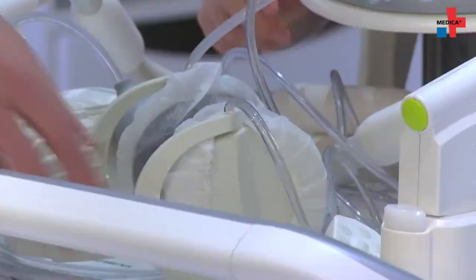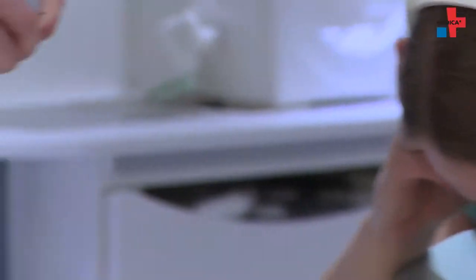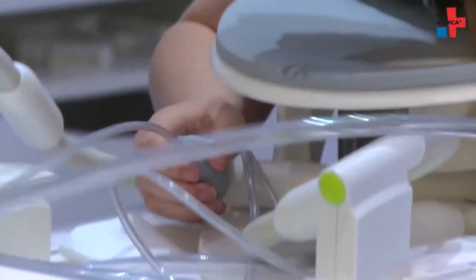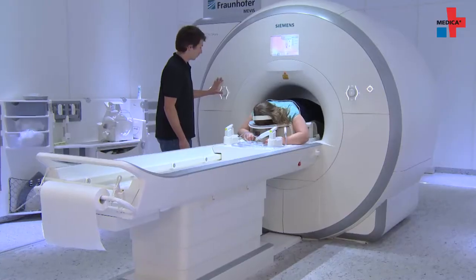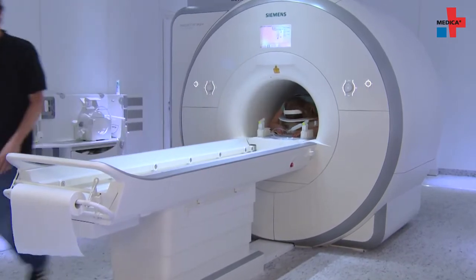What are the next steps in your project? In a first step, we want to jointly conduct evaluations with clinicians and radiologists and gather experience about the daily use of this software. We would like to find out how much time radiologists can actually save by using this system. We're also in contact with major manufacturers of software systems with whom we could distribute this plugin.